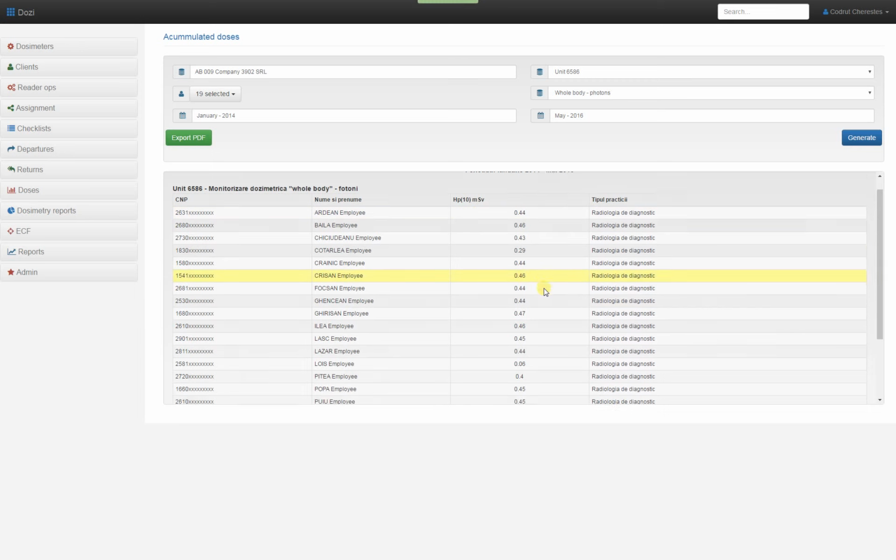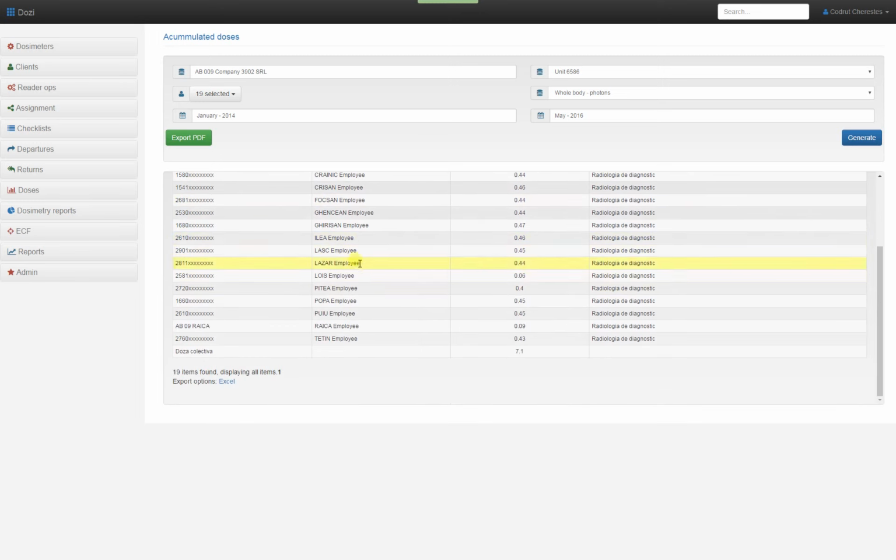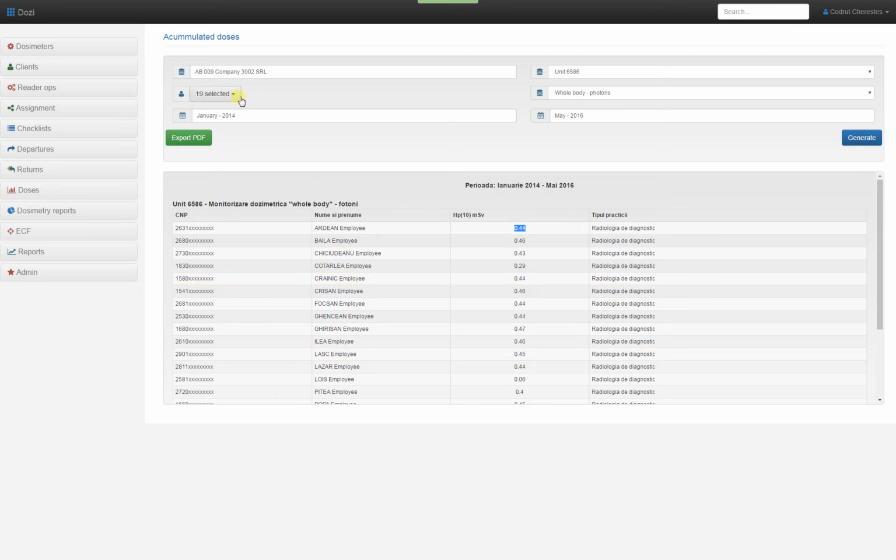And the system will just tell you the accumulated dose for each of the employees in this particular company.